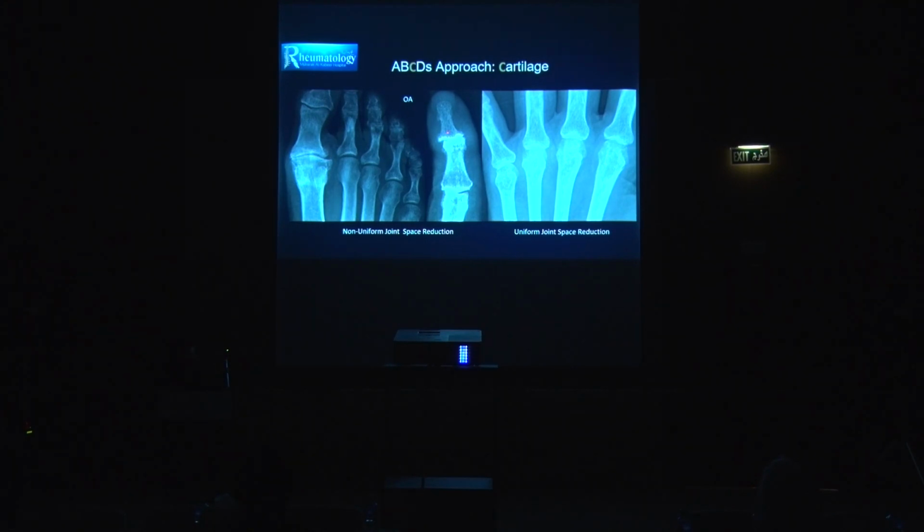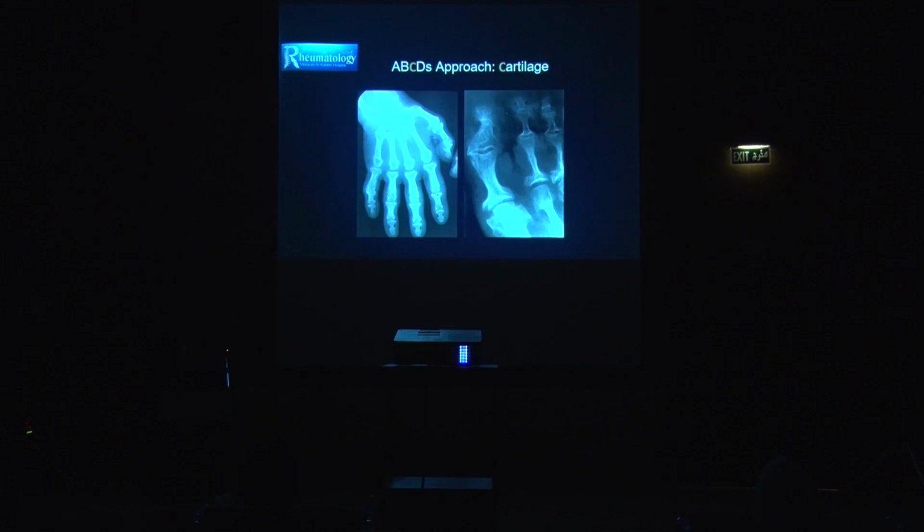And again, this is osteoarthritis here. Again, you can see the osteophytes, subchondral sclerosis, and asymmetric joint space reduction, and you can see the seagull. Right. Again, now this condition, this is increased joint space, right? So what condition can give you increased joint space?